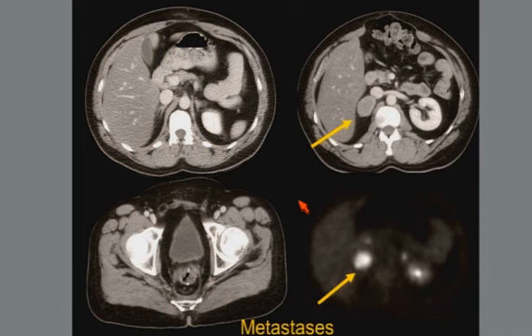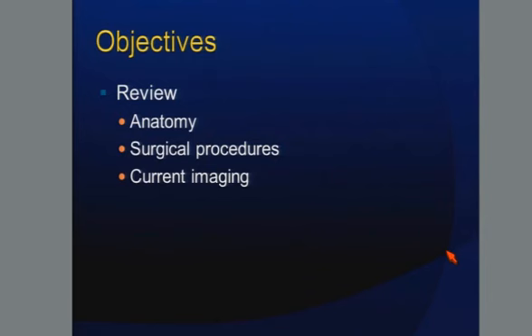This is a patient, again, we've got some PET imaging. Chronology is really important. We love old imaging because it's very helpful to watch tumor beds. This is post-resection, and you can see at the time, immediately post-op, patient had a normal adrenal. Now the patient no longer has a normal adrenal, and this was an adrenal metastasis. So chronology and being able to go back multiple prior imaging studies is really very helpful.